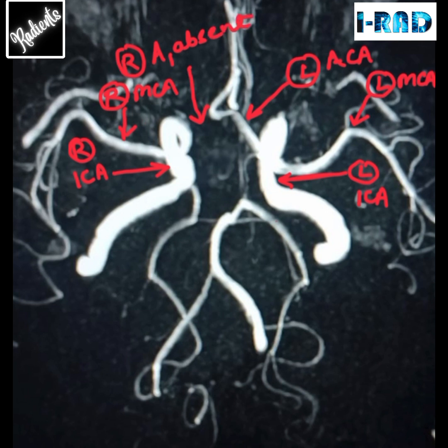Right, so if we look here carefully, how should it have been? This here is the right A2 segment and this is the left A2 segment.